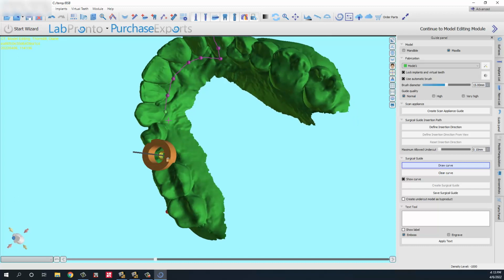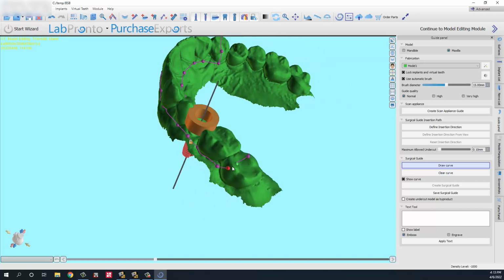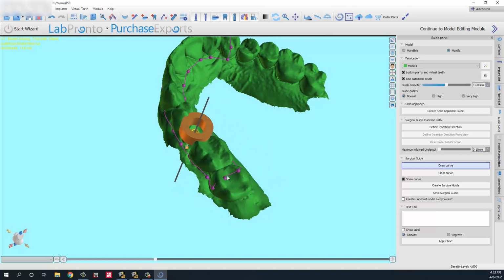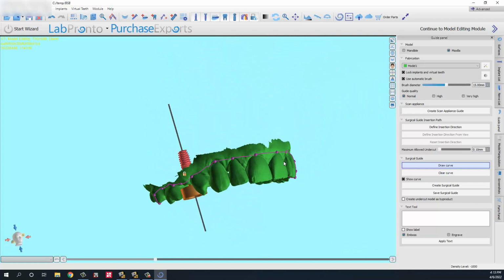I haven't. I've been drawing and then changing the nodes around for, oh, geez, coming up on a decade of using the software. So, yeah, actually I'm going to leave that here because I like to have, and I'll drag that one down. Okay, yeah, I don't like lines that are interrupted. Okay, so we're pretty good here.